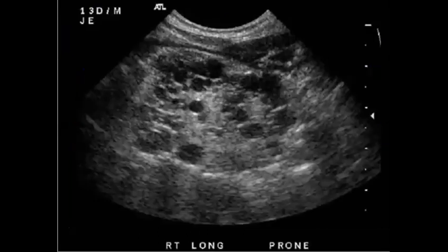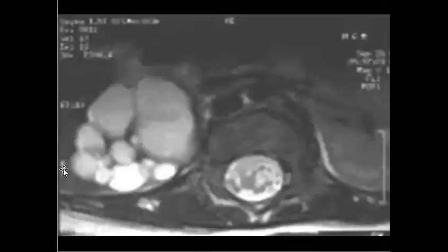So what about this one, which you have on ultrasound, and again you have cystic disease? Yes, what are you going to mention? Perfect. I like this question: what is the age? So if I mention that this patient is of young age, what are you going to tell me? Okay, then I better show you this one. So maybe he is in the pediatric age group. So what are you going to show me?